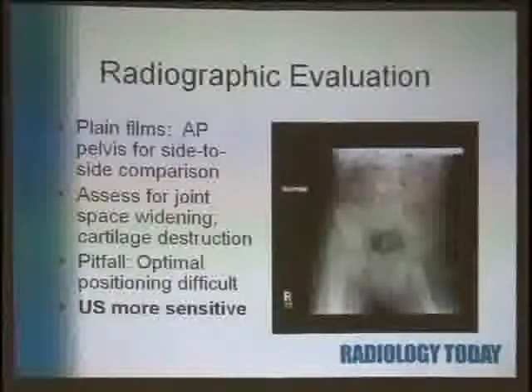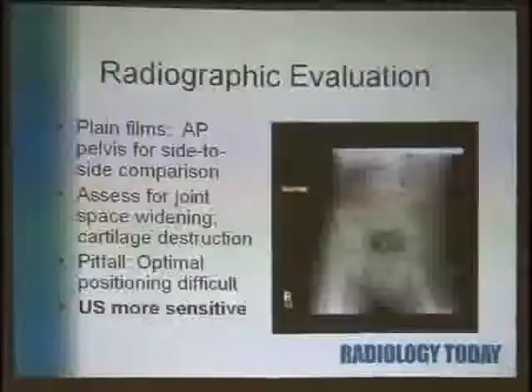And then the other thing you need to know is, I'm happy we got this film, because I can say, well, I don't see bad fracture, I don't see just gross destruction of the joint. But even if it's normal, I put at the end of my report, if you're specifically concerned about joint fluid, please get an ultrasound, because it's way more sensitive. This was read as normal, and I would have concurred, by a very good musculoskeletal radiologist, but we went on because of the symptoms and ordered a hip ultrasound.